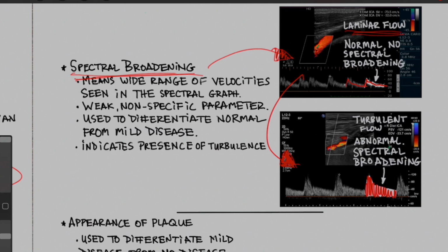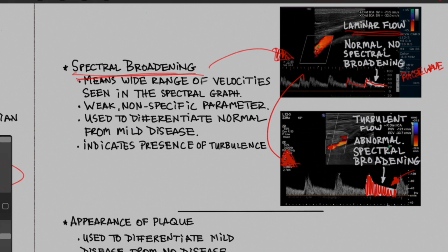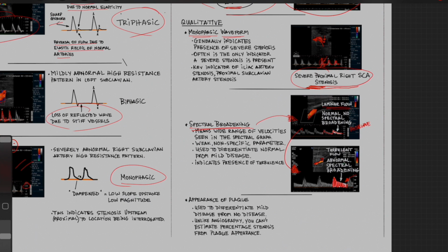It's the difference in appearance from a pulse wave, which is usually supposed to look like this in echo. Spectral broadening is when your pulse wave looks like a CW. Again, it's not a CW. It just means that there are multiple velocities in this location, a whole bunch of them, because it's turbulent flow.